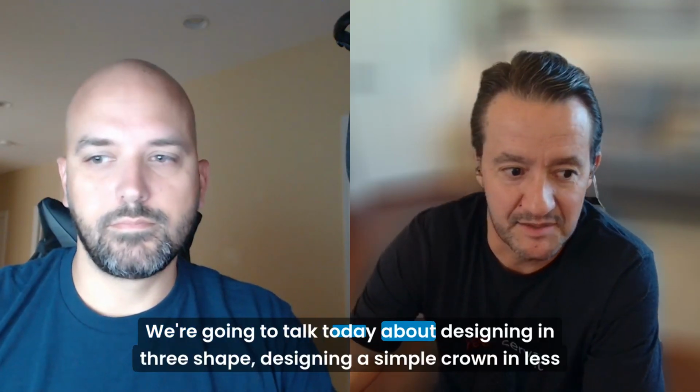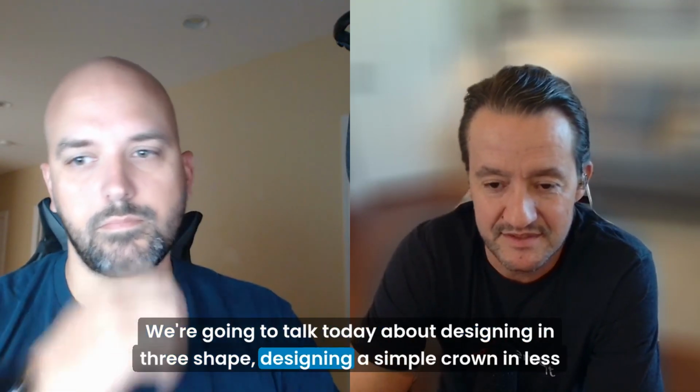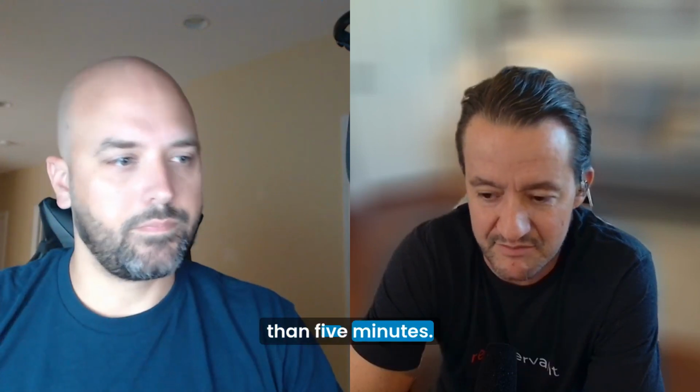We're going to talk today about designing in 3Shape, designing a simple crown in less than 5 minutes.